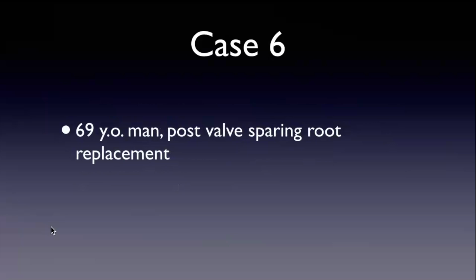Okay. This is it. Last case, kind of similar but different. So, 69-year-old man, post valve sparing root replacement. If you liked the last case, you'll really like this case.